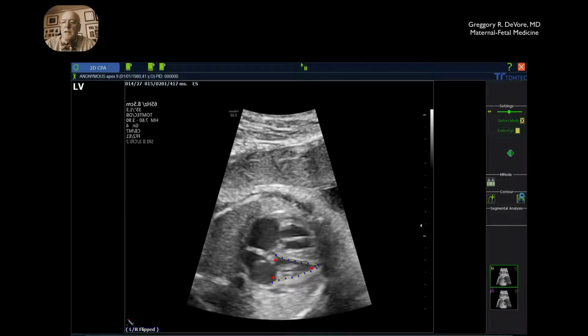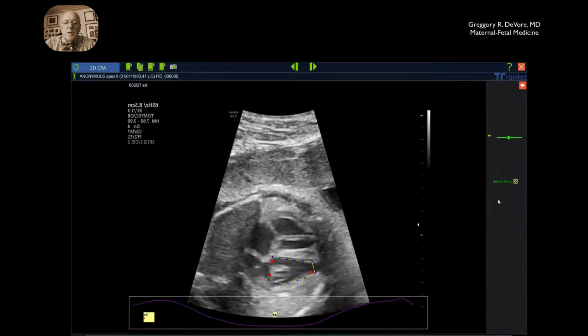I will now click this and go to diastole. Now this is very important. When the heart is located with the apex at 9 or 3 o'clock, this movement right here represents the atrial motion. This is the ventricular motion. So I'm going to take and place my dot right here and here, and I'm just going to adjust it accordingly.